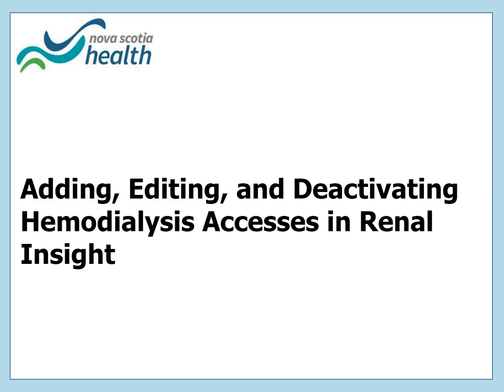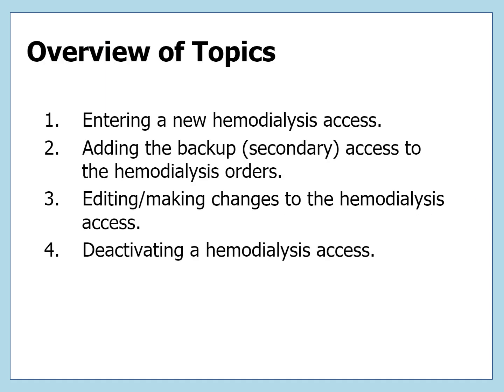This video will review how to add, edit, and deactivate hemodialysis accesses in Renal Insight. The topics that will be reviewed in this video include entering a new hemodialysis access, adding a backup or secondary access to the hemodialysis orders, editing and making changes to existing hemodialysis accesses, and deactivating a hemodialysis access.